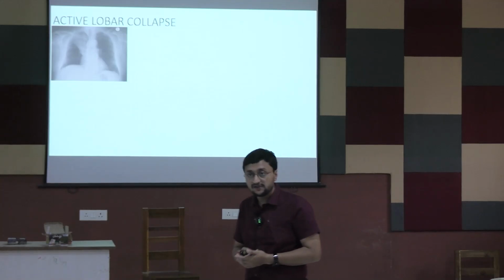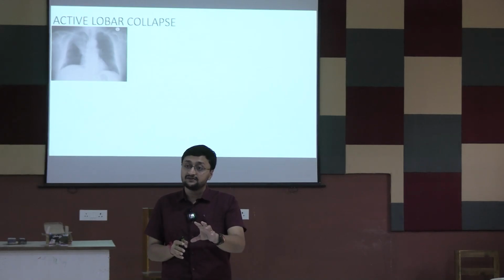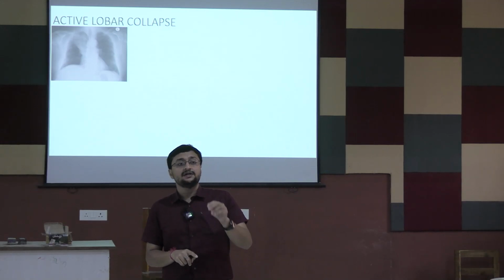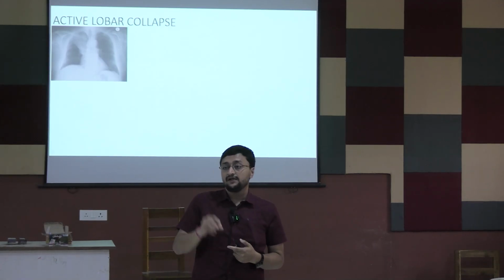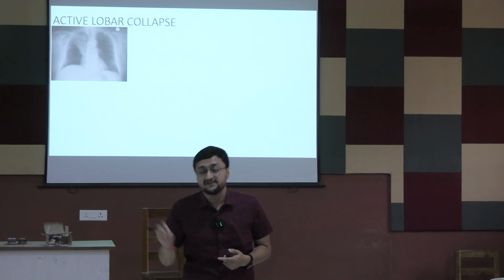In case of consolidation or pneumonia, never mention pneumonia in an X-ray. Always mention consolidation, right? In consolidation, there are bronchovascular markings and air shadows inside the opacity.